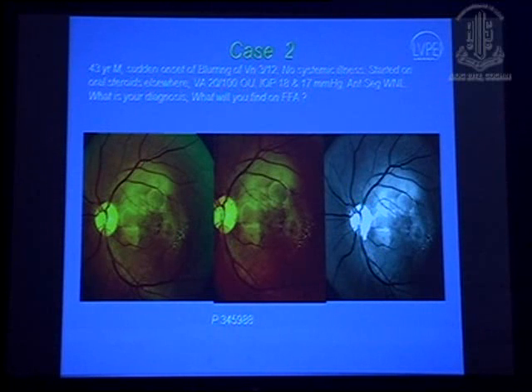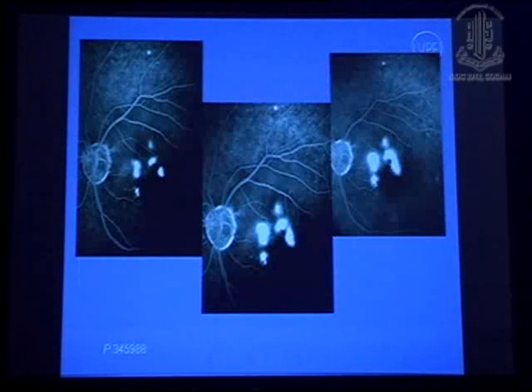Who will describe? Other than that guy, who will describe this side? That lady from the 5th row, this side. You go to the cream dress. Ajit, show the FA also. Yeah, show the FA also. Ajit, a little, if you point out people like this, they're not going to come for your course again.